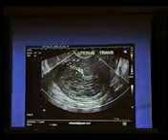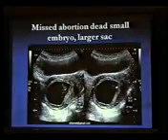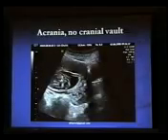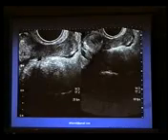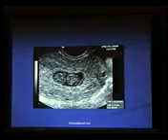Some more slides of RPOCs are here. These are vascularized RPOCs. A missed abortion, another case. Acrania. Large fetal tissue, less amount of sac volume, and oligoamnion.